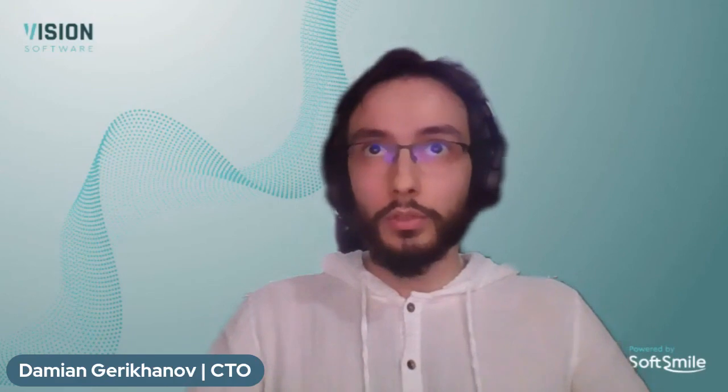So we're going to be talking about CBCT functionality that we added to our Vision software. CBCT, also known as cone beam computed tomography, is an advanced imaging technique which is traditionally used to extract volumetric data of the mandible, of the maxilla, and all the bone structures, as well as the roots of the teeth. And roots is exactly what we're going to be focusing on.